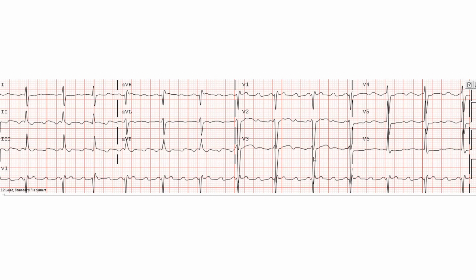There is also close to the Goldberger criteria I described earlier. Pronounced voltage in the precordial leads, reduced voltage in the limb leads. So it could also be suggestive of dilated cardiomyopathy. And this is what this patient had eventually, biventricular dilatation.